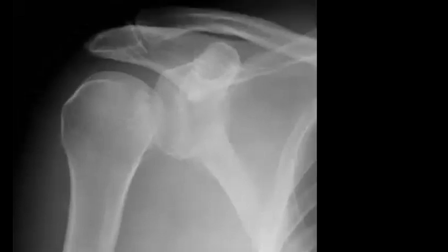Okay, now it's time to see where the abnormality is. The history in this case is sometimes important, especially in the viva, that they like maybe to give you the history of what? Do you know? Yeah, this is what is called posterior shoulder dislocation.